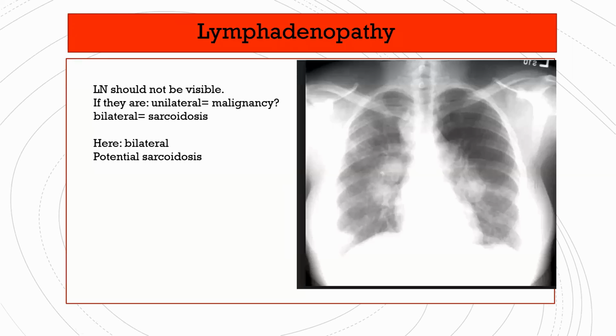So actually, this X-ray is underpenetrated. That's why it's all white. Can you see the vertebra behind the heart? Not at all. It's completely white. So this is what we call an underpenetrated X-ray. And when we get this X-ray, we might actually ask if it is possible to do another one, to repeat the X-ray, because the quality is not optimal, okay? Any questions at all?